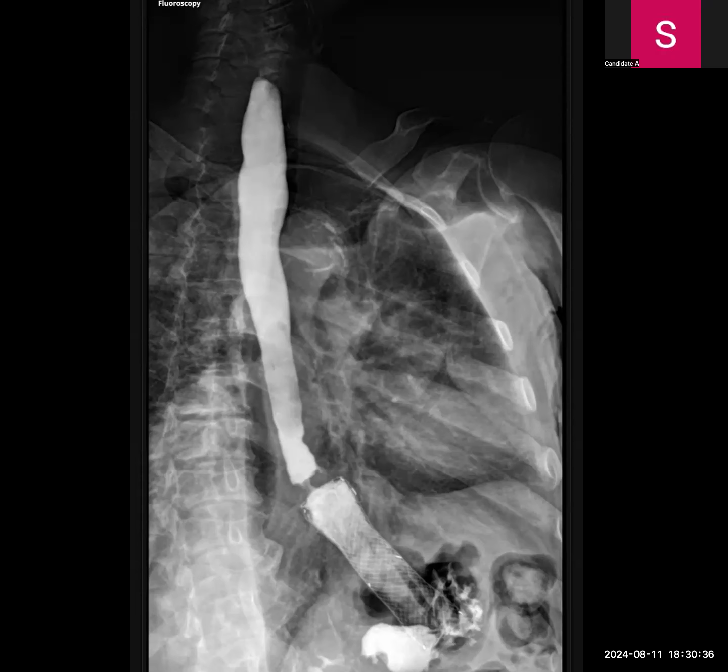No, because there is an area of stricturous abnormality still noted, so they need to pull it a little bit up than it is right now. Okay. So could this be a complication of a procedure? Can you think of something along those lines? Right. It could be a displaced stent.